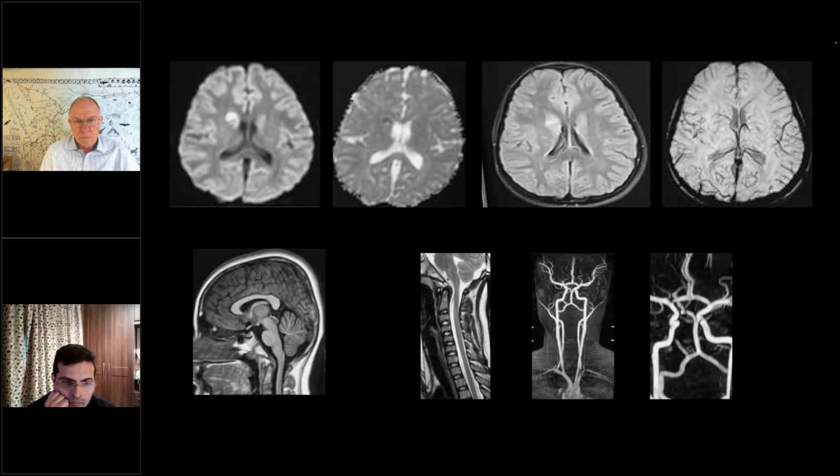The radiologist who reported the scan told me that there was a stroke which had happened earlier and healed. So he said there were 2 strokes in the same place. Is that right? No, I can see only a single area of restricted diffusion. It is low on the ADC. At what time frame was the scan done from the clinical onset? This was done immediately.